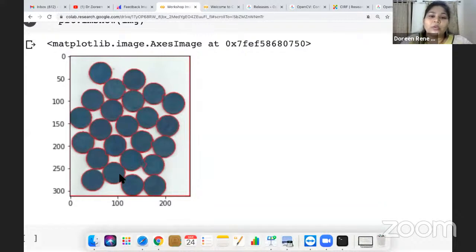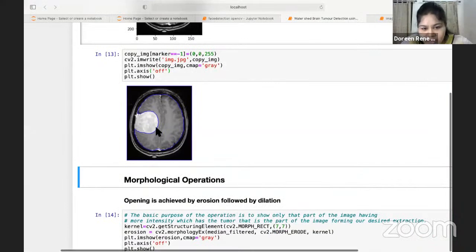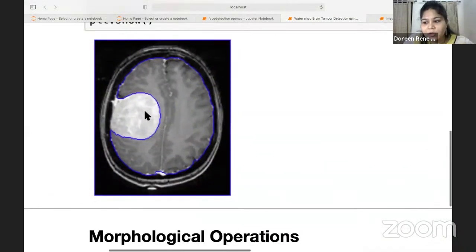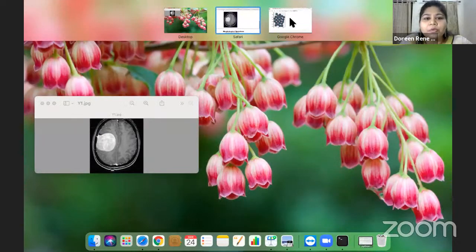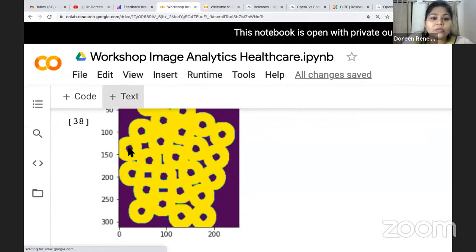The same thing, I worked with the image. Can you see? Yes or no? Can you see here? Yes, ma'am. Exactly. There is a part of the tumor here and also a little here. Can you see here also, a little here? Yes, the tumor spread here and there. And the same thing you could have seen in our contour also.